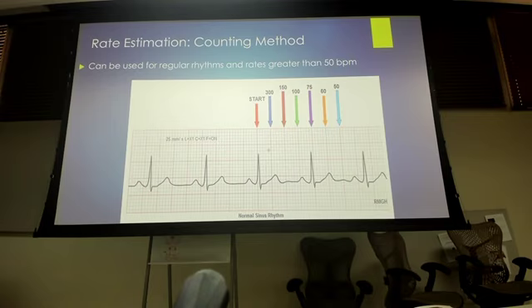Well, to be kind to you guys, I don't want you to have to do too much math, but I'll do a little bit. If you were to take out your phones and use a calculator: I just told you that between one dark black line and the other dark black line is 0.20 seconds. Well, 0.2 seconds, how much is that of a minute?